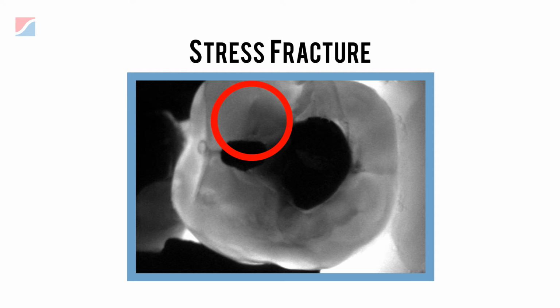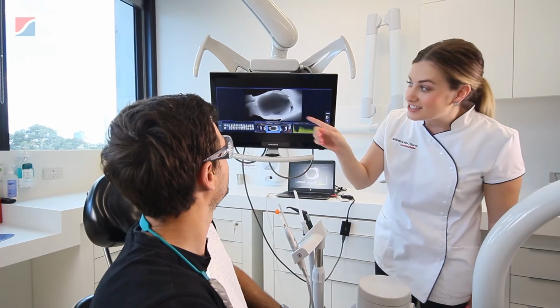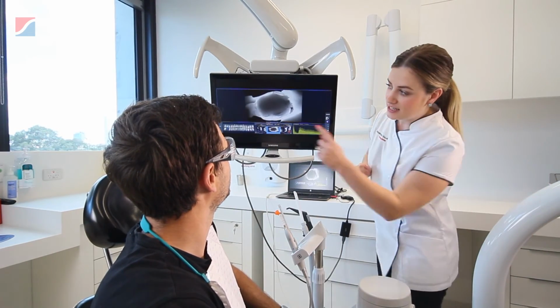When we use radiography in practice, we don't necessarily take an X-ray every time we're concerned about a tooth. The DIAGNOcam can be used every visit and is proven to be more accurate than radiography. Instead, say the patient may have interproximal decay. You can show them what it looks like at the appointment and then review it again in 6 months' time. That'll highlight to the patient the extent of the decay.